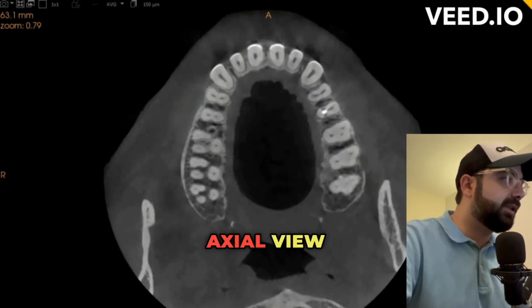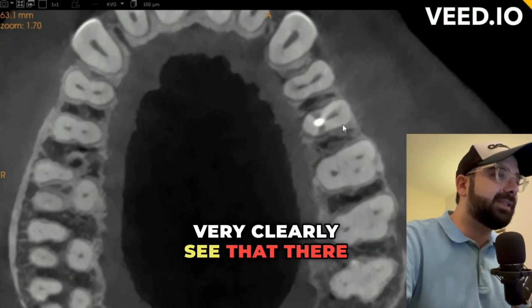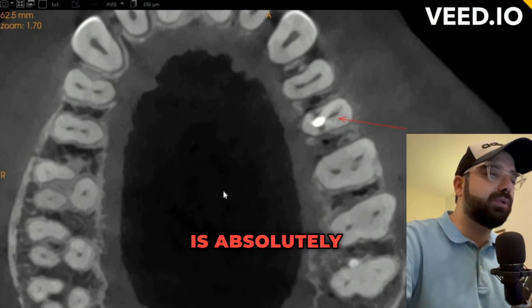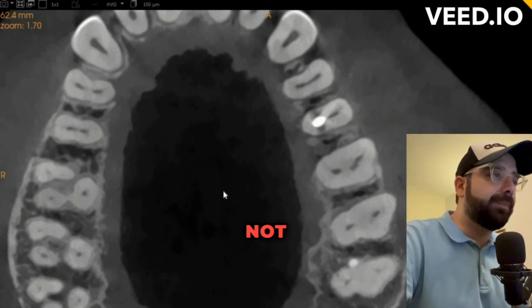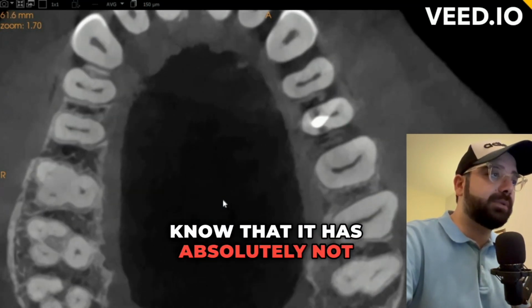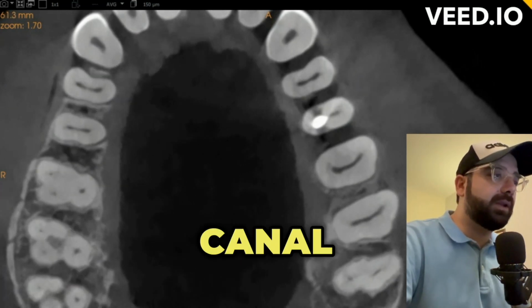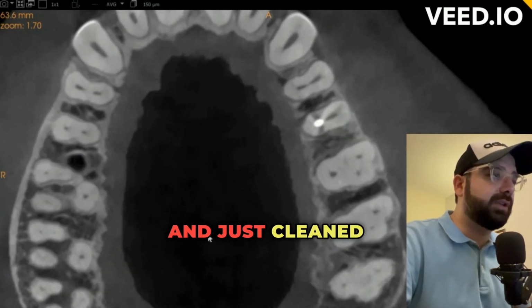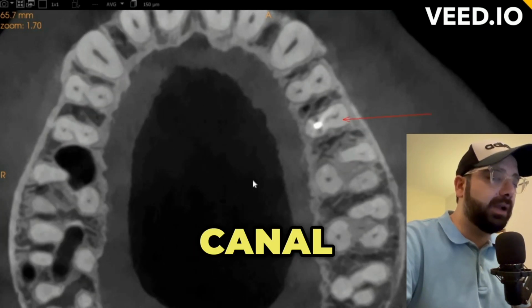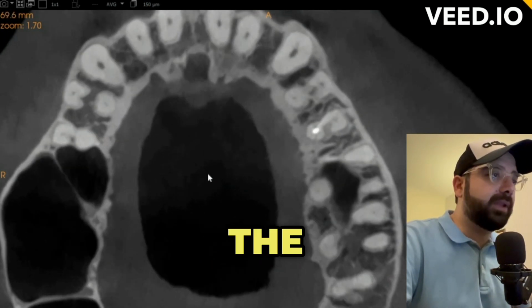This is the axial view, the top to bottom view, and here also we can very clearly see that there hasn't been any instrumentation, which is why this canal is absolutely not instrumented. So it's not rounded, which is how we know that it has not been instrumented at all. So they went through the chamber, found one canal, and just cleaned and obturated that one canal, and this particular canal has not even been instrumented, and hence this is where the infection starts.